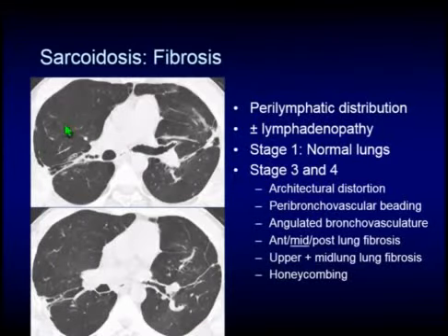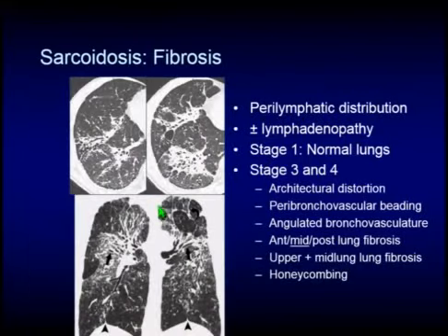If you were to look at this patient, dividing them into thirds in a coronal plane, you can see that characteristic of sarcoid, the apico-posterior segments are the first and most severely involved, and it's a middle third disease here. See that in two different cases. And as you all know, these areas of fibrosis are going to gravitate to the mid and upper lung. And again, coronal and sagittal reformats, as well as chest x-ray, really help you in cases of diffuse disease to see where the predominant portion of the disease is.